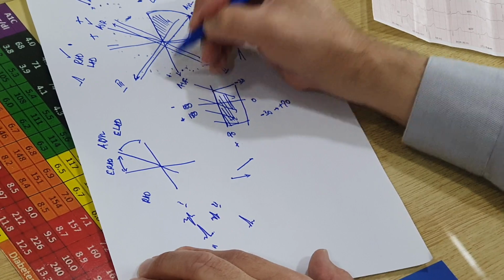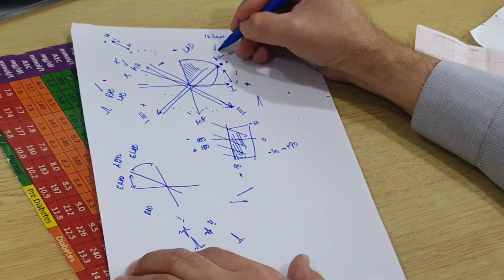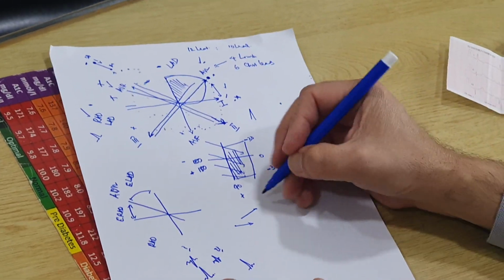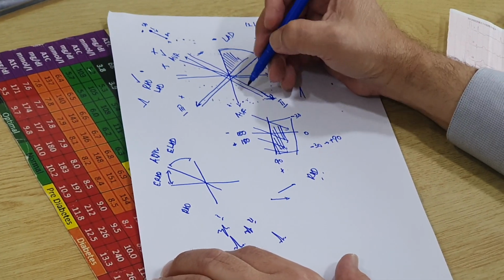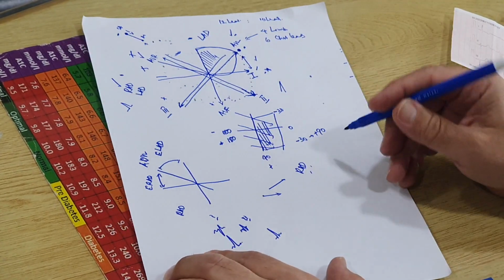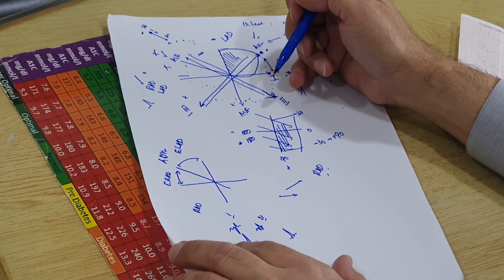So if you get a positive in AVF, we've got a positive in lead 3, but we get a negative in AVL, we get a negative in 1. This becomes right axis deviation. So in this way, you can calculate the right and the left axis deviation.